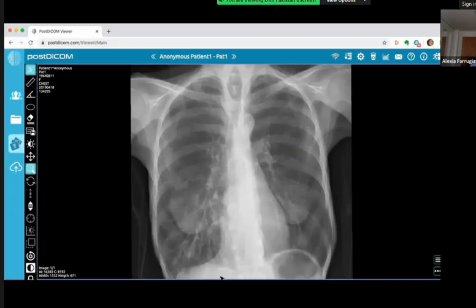That's just about what you can make out on the plain X-ray. Then you would need a CT to further outline what's happening in the mid and the lower zones on the right side.